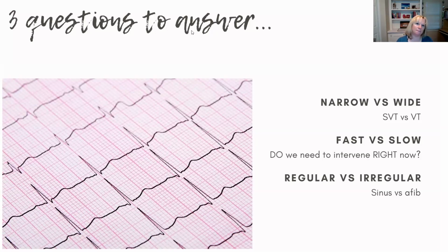And you're using the R to R intervals to do so. So if you come over here, this is the R to R right here, nice and regular, okay? This is obviously not an EKG that's meant for decoration, but I wanted to draw on it anyway.